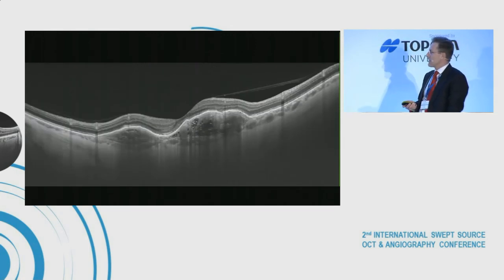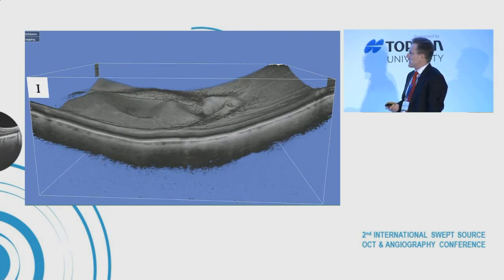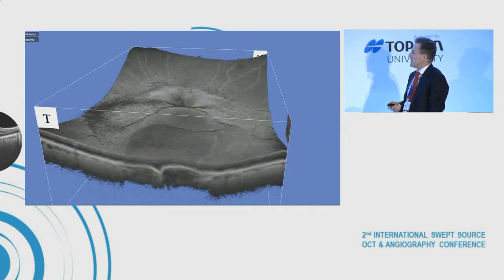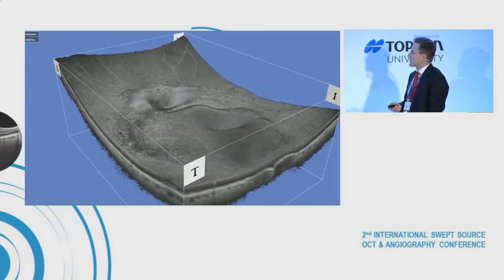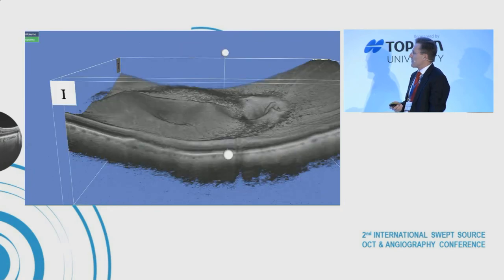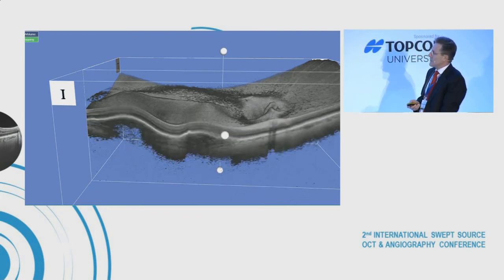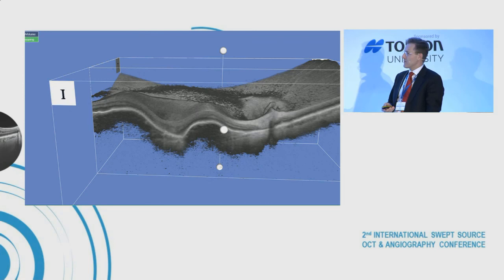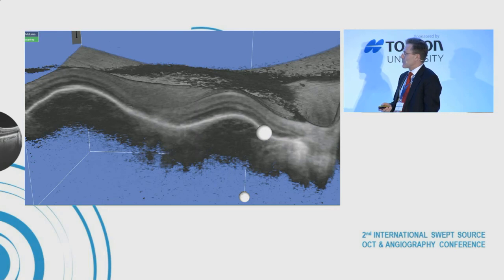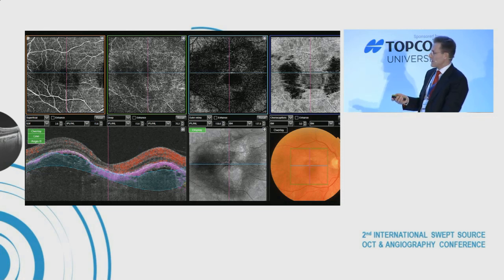This is a vertical scan, and now we do the spelunking and climb through the retina after having looked at it a bit from above to get the 3D impression. And here we go. Cutting away, slice by slice, we see the structure of the vessels. And now here the shadow is so bright that there's actual loss of signal from the bottom of the structures. But there is a point to this, and we have also OCTA in the instrument.